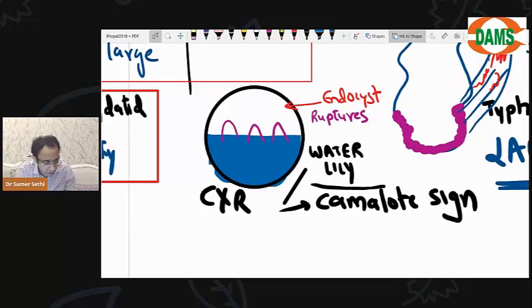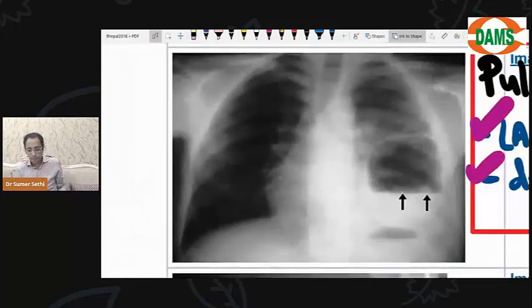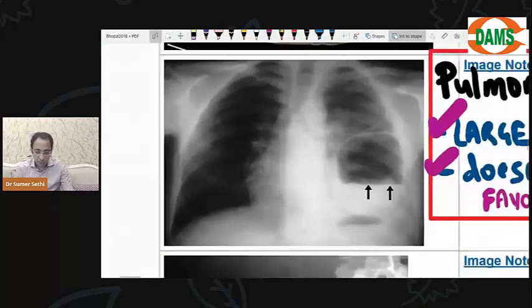Okay, everybody understands? So I'm teaching very slowly, so sometimes you might be thinking that it has paused. No, I think it's not paused. Everybody clear? Okay, now let's identify this previous question from the exam. Can you find the problem on this chest X-ray? This is the right side. This is the disease.